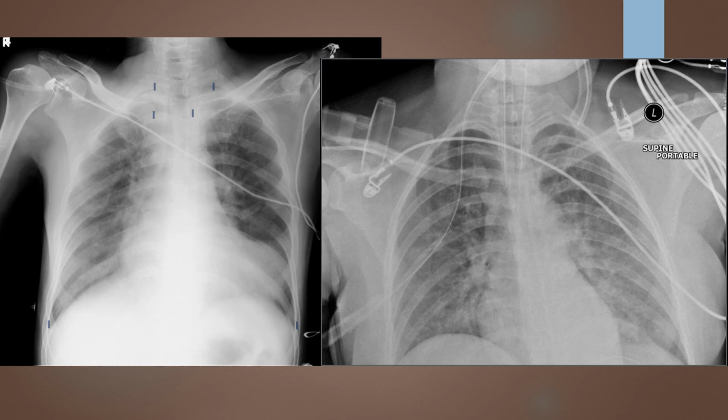The other thing I can look at is to see if I had better penetration here. I could evaluate the spinous processes within the thoracic vertebra, but because of the limited penetration, I just really can't tell. Over here, I can see that my lung fields are relatively close to symmetric, so I'm going to use that SC joint indicator as my most sensitive evaluator.